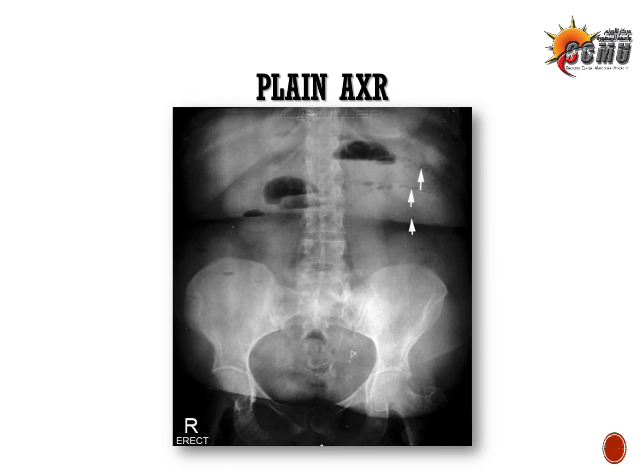The next sign that you might know is the string of pearls. When you connect pearls together on a string and you see it from afar, you'll see only the pearls, okay, and that is what we can see with the white arrows. And actually, this is diagnostic of obstruction of the small bowel.